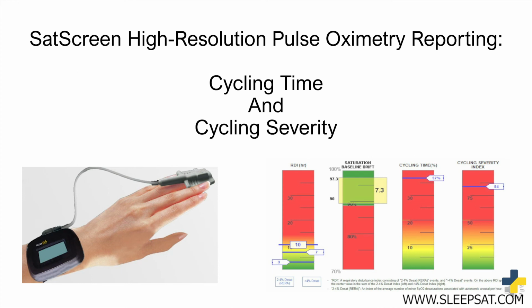In this video, we will be reviewing the cycling time and cycling severity graphs that appear on the first page of the SatScreen report.